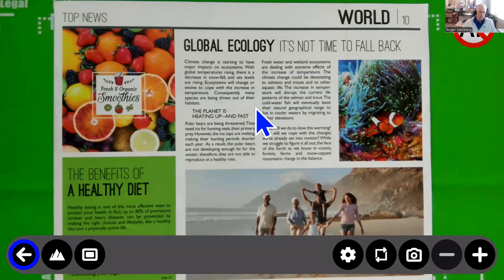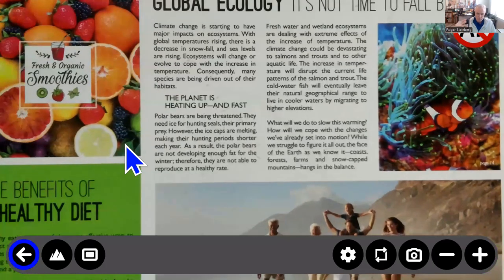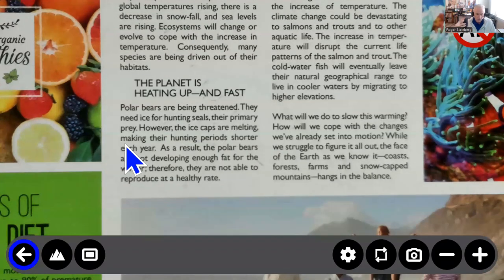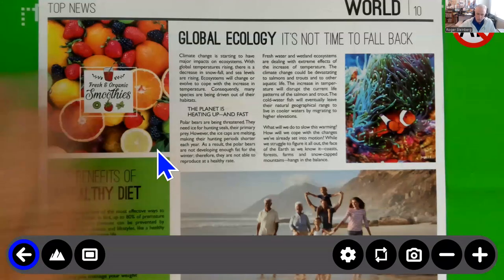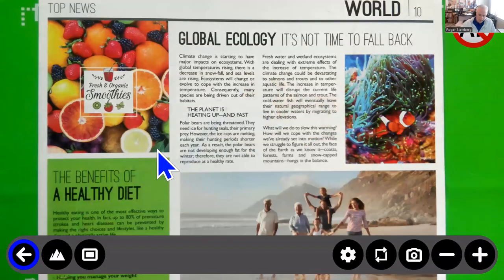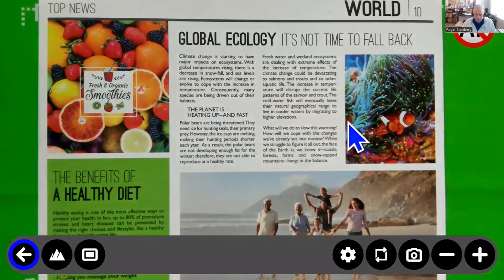So now you can see here, I opened up my magnifier, and this is my Solo 8 camera. I'm using, again, that starter kit setup with a camera and software installed on a PC. And here I go, I have my camera focused on a document. In this case, I'm using the wheel on my mouse, holding it up if you're looking at my video, to zoom in and zoom out on my live document. I can move my hand in here, and you can see a little bit of effect on the lighting when I put my hand in there.